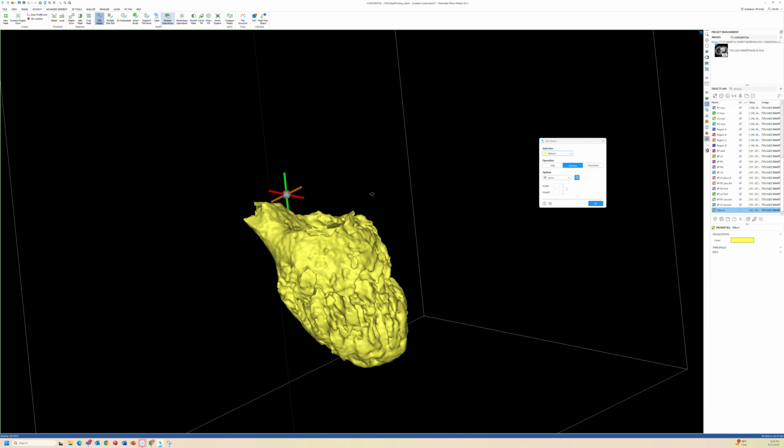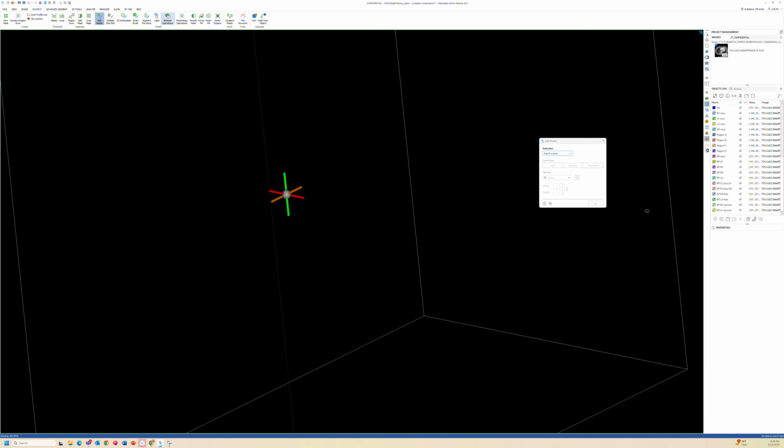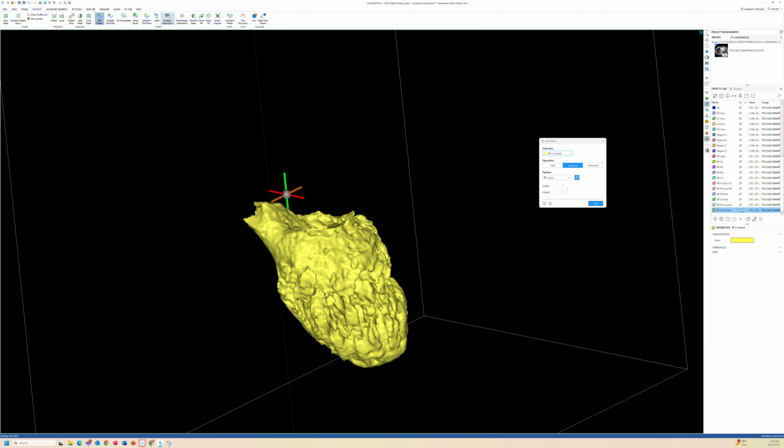And so this is how we're looking to generate those. Let me label this BP, LV, second, just because we did the LV first time around, so we just wanted to designate this.